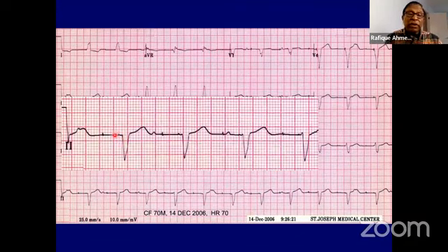Now, the blanking period is designed to make the pacemaker blind for a very brief period of time. And it is usually between 40 to 80 milliseconds, not more than that. So if that was true, then it would have been over here. If it didn't see any P wave over here, it can be a blanking period or within the atrial refractory period. But this is way outside. This is about 400 milliseconds outside. So this is not in the blanking period time.